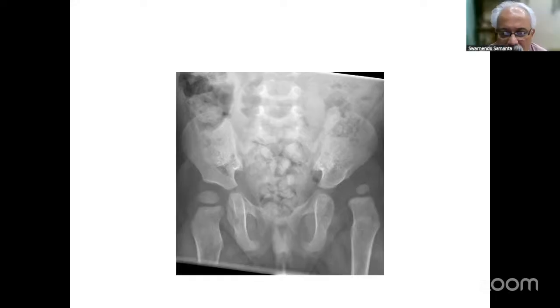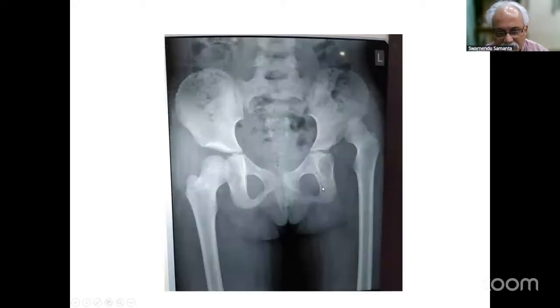Yes, very good. So remember, in your viva you will definitely be asked about these 2 lines once you see developmental dysplasia of the hip. Okay. So this is another one. This was traumatic. You can obviously tell that this was a traumatic one. Okay.